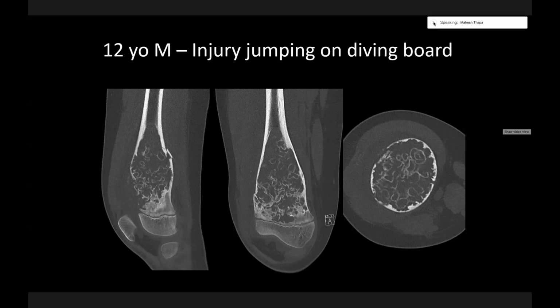Osteoblastoma is something that I think of sometimes when I see this sort of funny calcification, expansile. There are two forms of osteoblastoma. One looks like an osteoid osteoma, the other one's more mass-like. And you've got this scalloping also of the cortex, particularly visible on the axial images. So it looks benign. That's about all I can say. I think with your thought of fibrous dysplasia, because fibrous dysplasia can look like anything, and it certainly is expansile. It looks fairly benign.